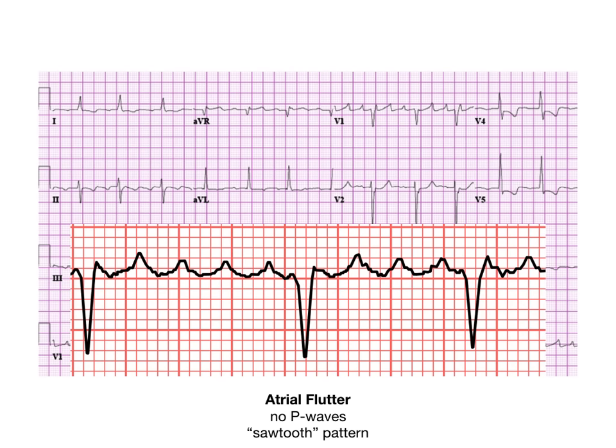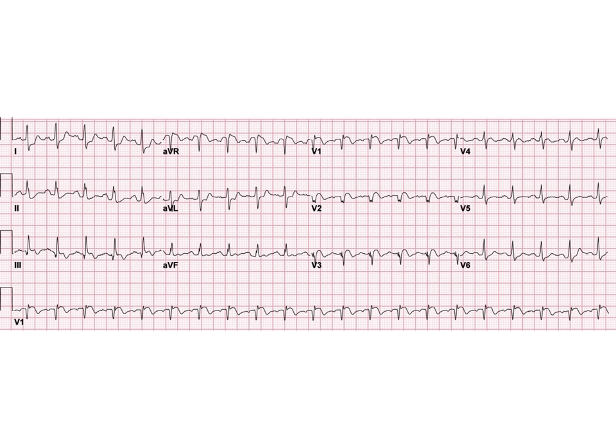So look for P waves, and after that, just look at the ECG and get the pathologic finding because it's going to be obvious. So we've done AFib, we've done A-flutter, we've done STEMIs, and we've done Wolff-Parkinson-White Syndrome with the upslanting delta wave. Let's move on and talk about some other really high-yield ECGs that don't get a lot of love in other review sources, but I think you should know because if you could pick them out and correlate them to something in the vignette, you're giving yourself free points.